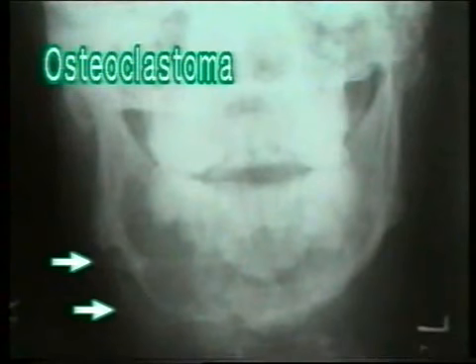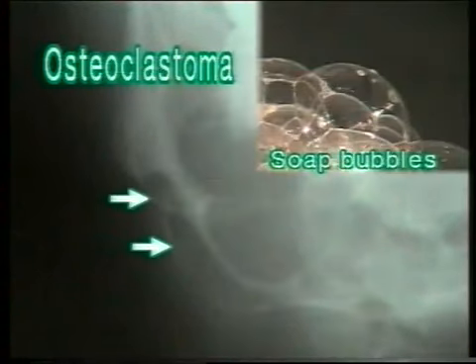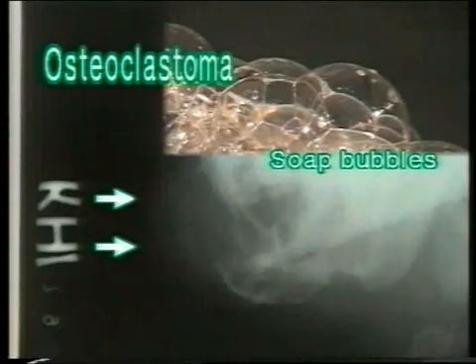This is an osteoclastoma of the mandible. Compare the left ramus and the right ramus. Note the radiolucent bony expansion with thinned out cortex. A very classical soap bubble appearance is seen in this close-up view. Compare it with the soap bubbles in the upper right hand corner. In a lateral view, the soap bubble appearance is seen even better, the thin bony septae surrounding rounded areas of radiolucency. This is an osteoclastoma of the mandible.